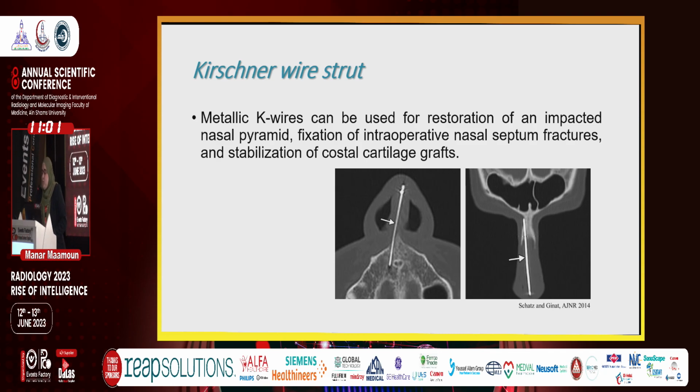You should be familiar with the appearance of the metallic K-wires that can be used to fix nasal septum fracture or stabilizing a costal cartilage graft. It's usually inserted into the maxilla lateral to the incisive canal.